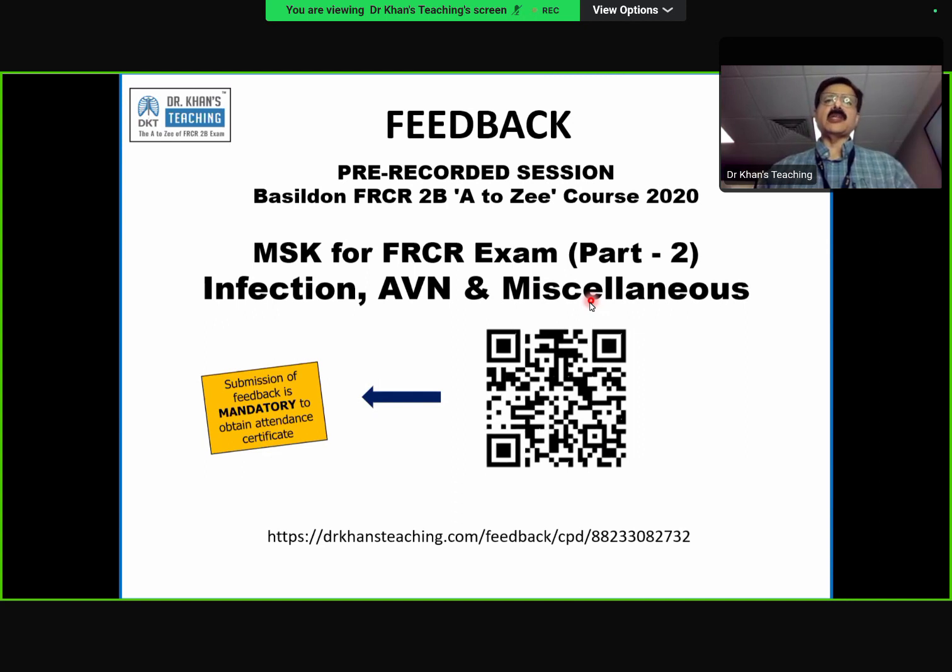It will be a different signal. Having said that, every case is not like that. Every case will not have a high signal. It is just a finding which you will see in some of the cases.